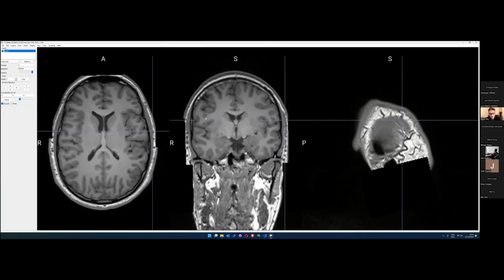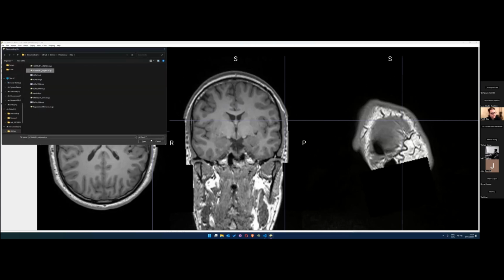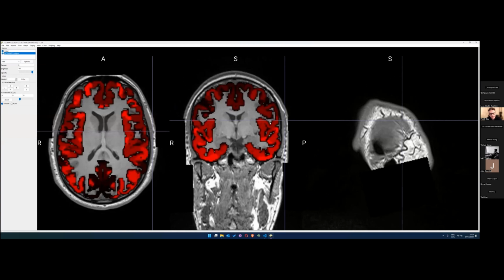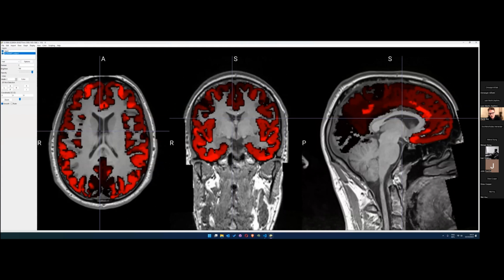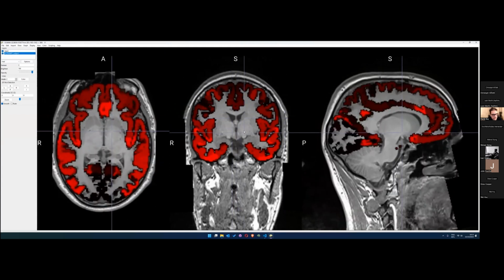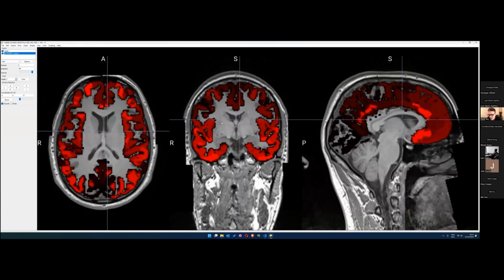So now if we take this, the original input image, and we overlay the HCP subject, we see that now it is in my space, as opposed to before where we had it being in a totally different space, someplace totally else. Again, of course, it's not a perfect match, but it's a close enough match given how simple a registration step we did here.